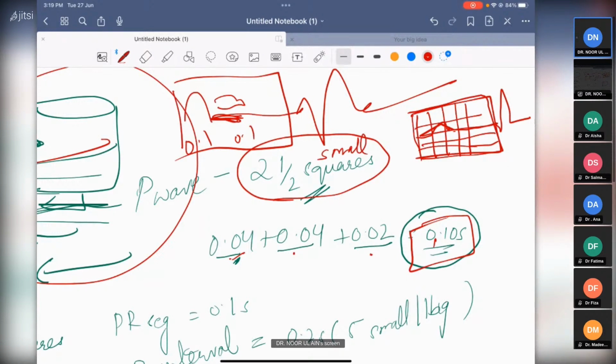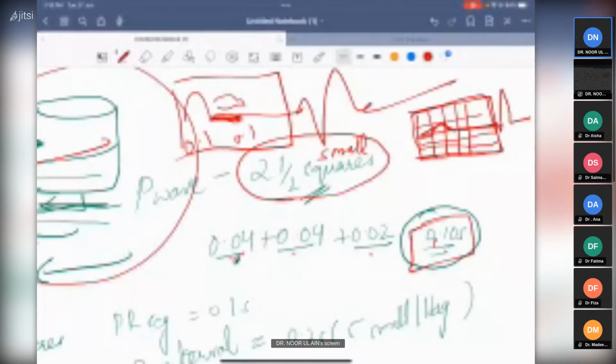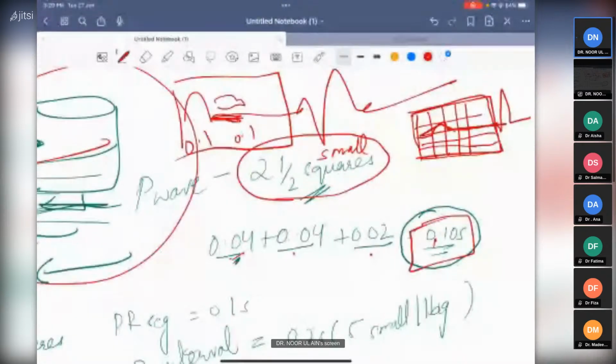Clear, guys? That was my last point. If somebody asks you how long does an atrial depolarizing event take, literally 0.1 second. And how would you represent it on an ECG strip? With 2.5 small boxes. And to make things easier, what comes after the P wave? There is an isoelectric line, right? Atrial repolarization, but the ECG does not pick up anything.